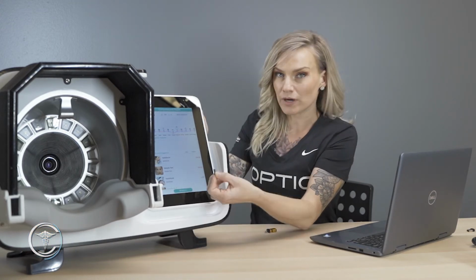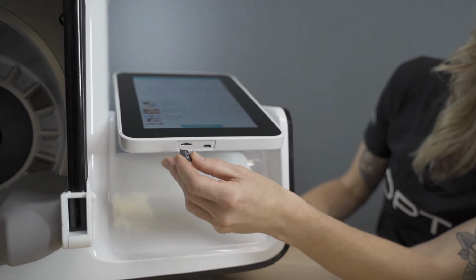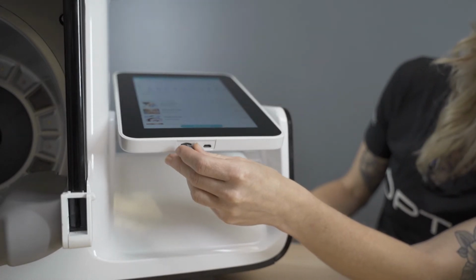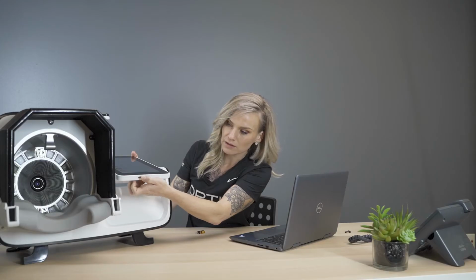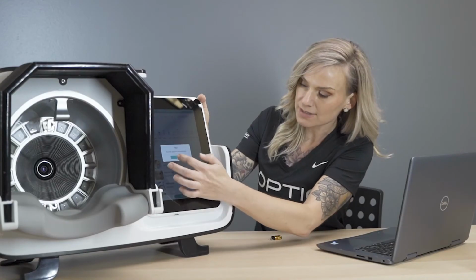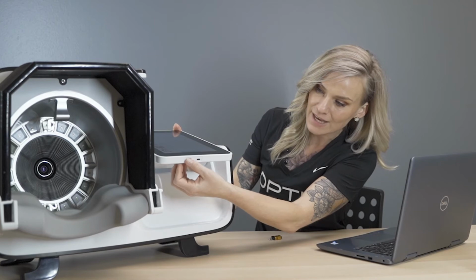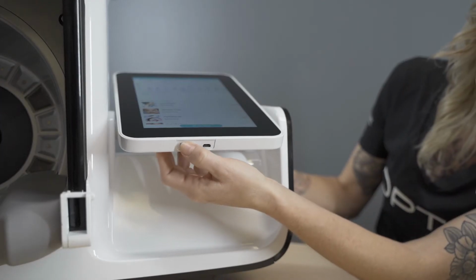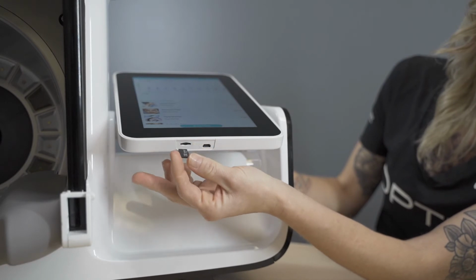Sharing customer files through your desktop or laptop computer. First, we need to put our SD card into the tablet. Putting the SD card into the tablet, we're gonna make sure those white letters are faced up. We're gonna slide it in until we hear a little click. We hit SD card save. It's saved to it. We'll press OK. Tilt it back to get the SD card out. To take it out, we'll push in. We'll hear the click, and it pops out.